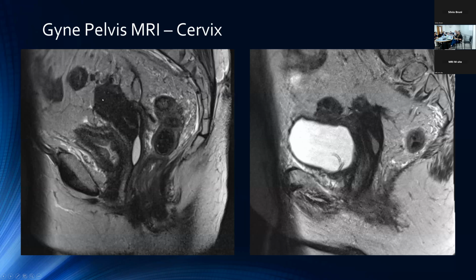But here on the left, you can see a little bit of fluid within the upper vaginal canal, and then this oblong T2 hypointense structure representing the in situ cervix. You can make out a tiny strip of the endocervix more inferiorly, but again, your line is just drawn along the bulk of that cervical stroma and best approximating the endocervical canal there.